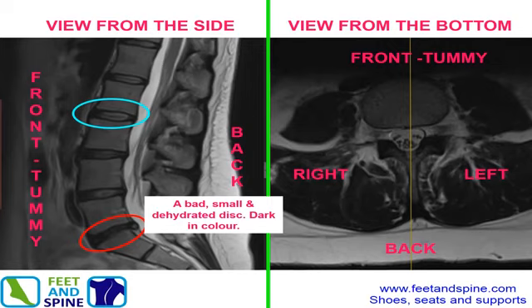Unfortunately, some discs are damaged. L5, S1 for example, is darker, not very plump and dehydrated. This means the disc does not provide good cushioning and so may cause back pain. One of the treatments of this cause of lower back pain is to exercise the core muscles to better provide support to the lower back when there has been disc degeneration.